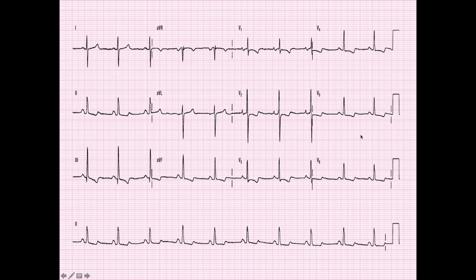But what about right ventricular hypertrophy? And you're thinking, well, it's probably going to be right ventricular hypertrophy because that's this lecture, right? So, hey, look at that. So we look at V1, V2. Is it more positive than it is negative? V2 is a little bit more negative than it is positive if you take out those calipers that you bought. Right? The big like 20 pack of calipers that you bought. V2 is a little bit more negative, but V1 is definitely more positive than it is negative.